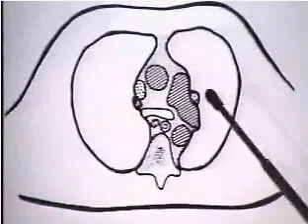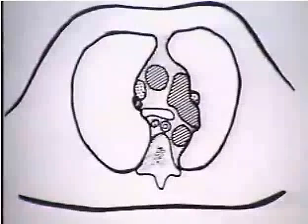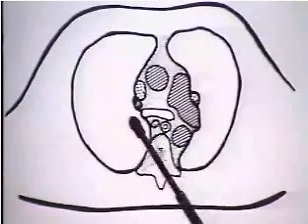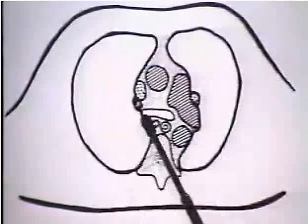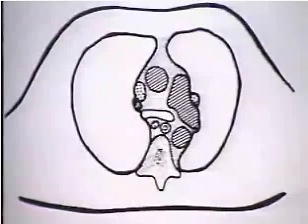You'll often see a vascular structure over here, and we'll be taking a better look at what that is in a moment. On the right side also, we'll see the superior vena cava, and again we may see a vascular structure crammed in next to it on some CT scans over here.